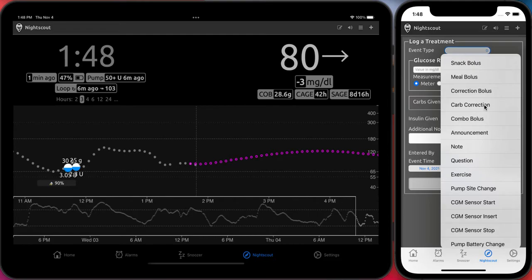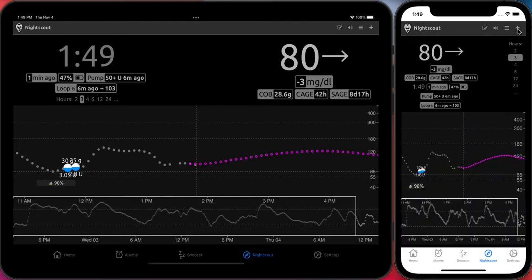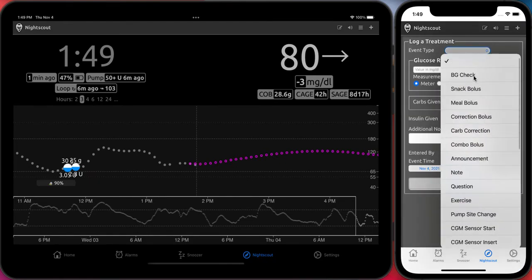Nightscout saves these entries as strings in computer language. So if you enter a carb amount here, it's technically, while not spelled out like the number 5 versus FIVE, still treated as text rather than treated as a number, where Loop treats it as a number when it uploads it. So you never want to enter carbs, bolus, basal, etc. in Care Portal of Nightscout. I do have most of the code everywhere I've been able to find in Loop Follow set to ignore those, because otherwise it will crash the app.